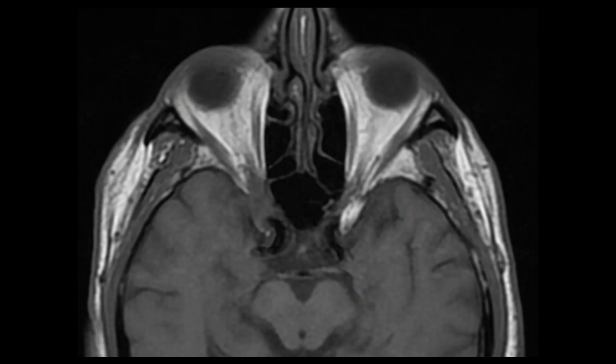So I had to pull up this study. And again, just like we started talking about the importance of pre-contrast T1, these surgeons had started in the sinus and quickly found themselves in the orbit when they were chasing this disease. And if you look closely here, these optic struts are very different. We see the bright marrow fat on this side, and over here we've replaced the fat at this location.